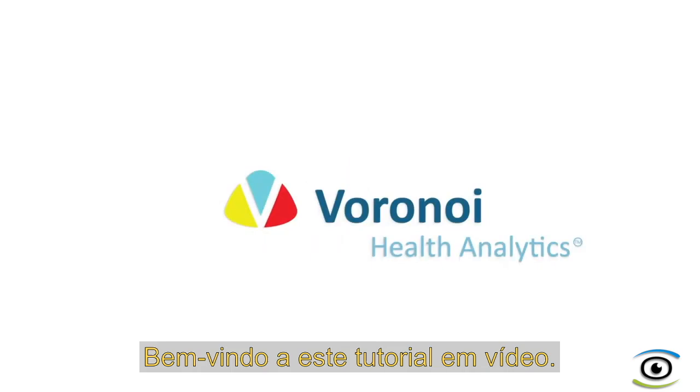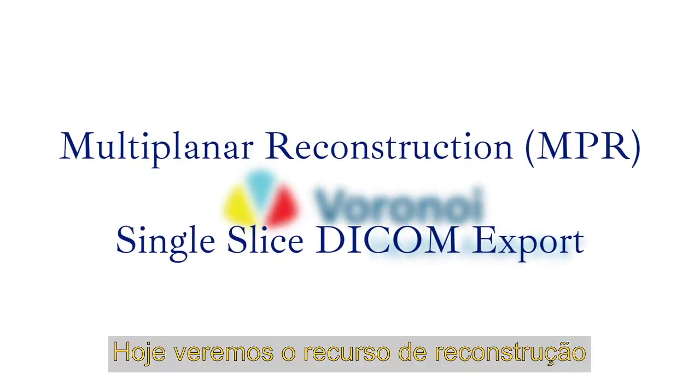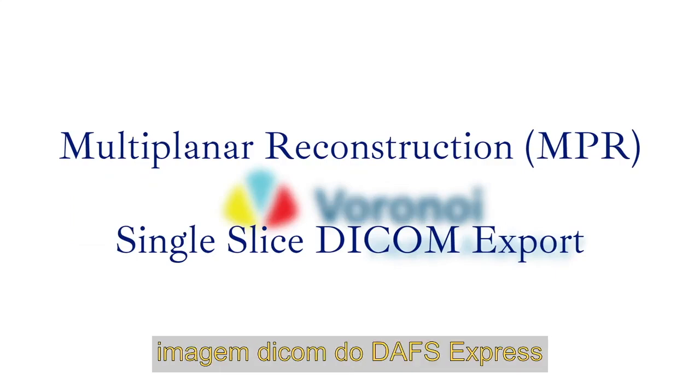Welcome to this video tutorial. We will be going over the new multiplanar reconstruction and single-slice DICOM export feature in DAFS Express.